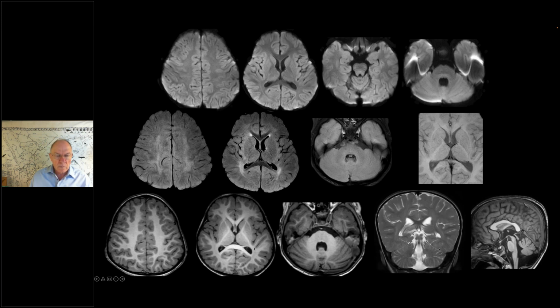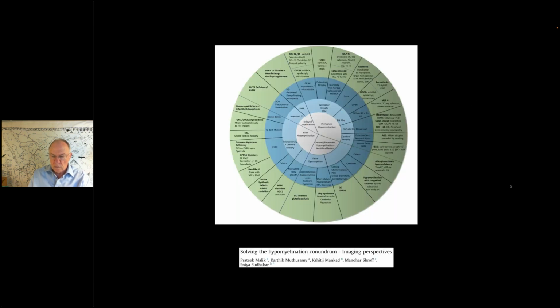On T1, the myelination appears to be normal, but on the FLAIR, you can appreciate some degree of delayed myelination or a possible hypomyelinating pattern. No volume loss in the supra or infratentorial brain parenchyma. A slightly reduced volume of the brainstem, in particular the midbrain, and a mildly hypoplastic vermis. But other than that, I cannot appreciate any other findings. So probably going down the pathway of delayed myelination, hypomyelination. I think Sahil has a diagnosis. If you can give out the diagnosis, we can go for further discussion.